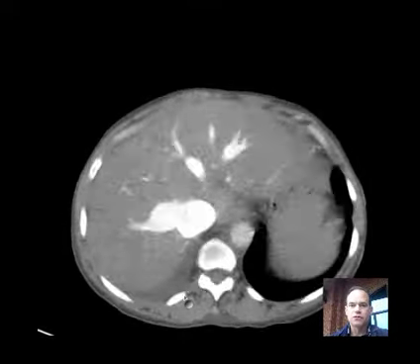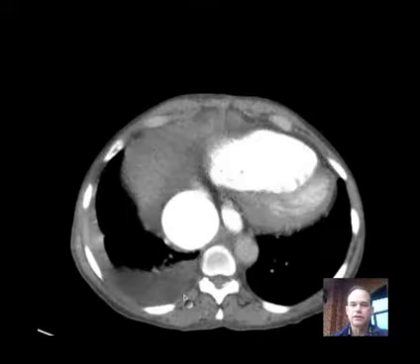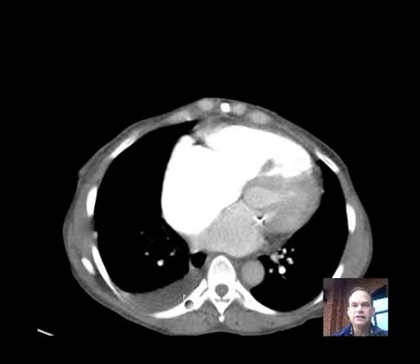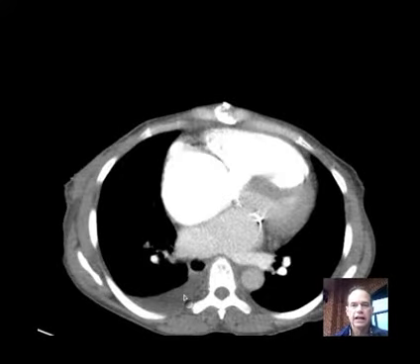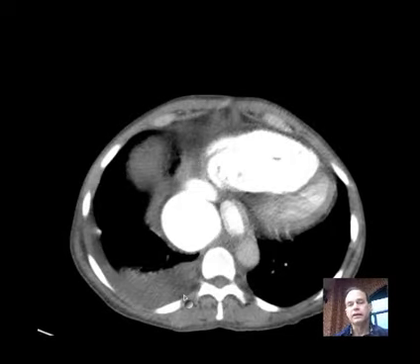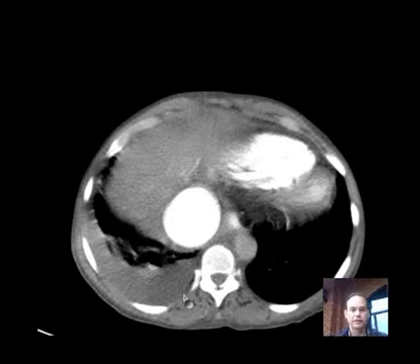I hope by now you've familiarized yourself pretty well with the anatomy. And so remember, the key process is to look at a set of images like this and identify what kind of abnormality is present, or abnormalities, and be able to describe the anatomy that is involved with the abnormality.